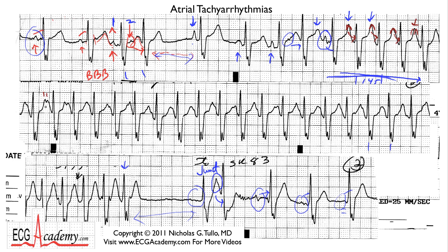I have a feeling that the first one is the P for the same reason, that because it's a fast rate, you get a longer PR interval, you get slowing of AV conduction, and the QRS complex will occur late, but the T wave remains somewhat delayed because your QT interval here is pretty long, about 400 milliseconds. But you can see how this is a little bit wider, and then it gets a bit more narrow. These two bumps are independent. One is the P, one is the T, and you can pick them out. You can pick out that P wave apart from the T, and you can say there's a P wave in there, and this is an atrial tachycardia, until it finally breaks here, and then the patient's back in some kind of escape beat and then a sinus rhythm of sorts.